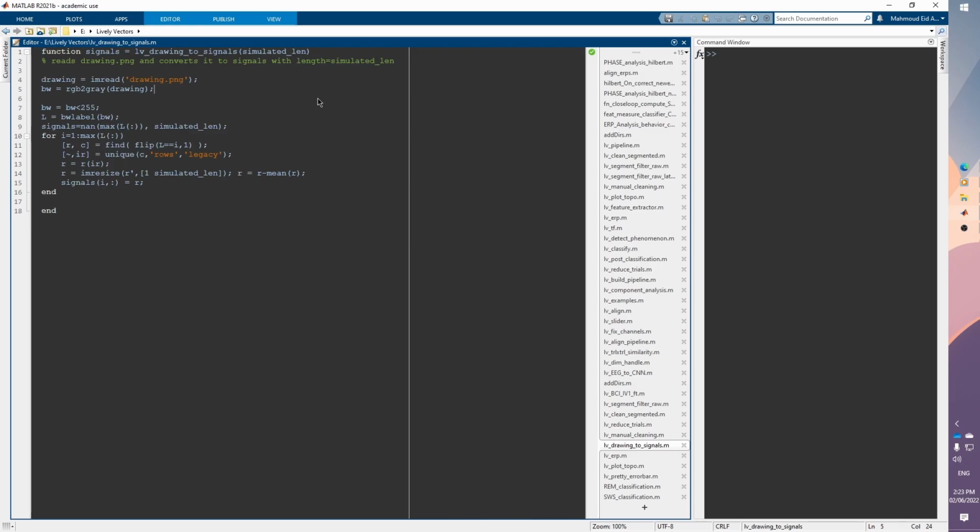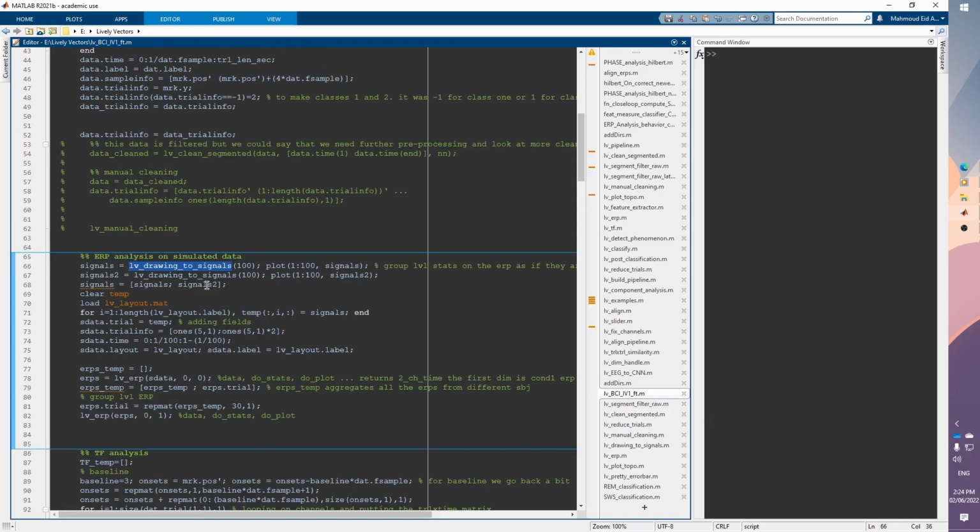So we basically take the minimum and the maximum, we resize our drawing, and we start by thresholding our data to just know the positions of the plotted signal. Then I do this in a loop by defining different black and white connected points. I need to draw many signals, not just one, and I put them underneath one another such that we'll have rows of many signals, and the columns will be the time samples. So let's try to do this.